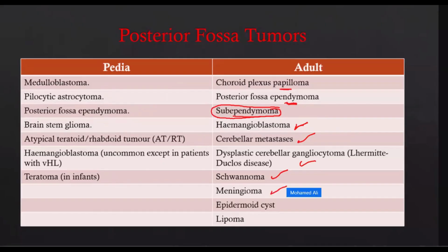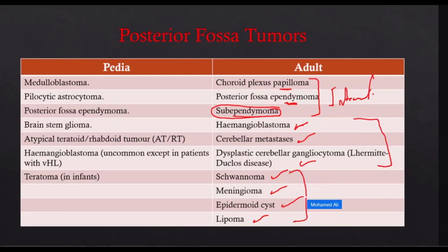Meningioma, we saw a case of meningioma. Epidermoid cyst, we saw a case of epidermoid cyst. Lipoma also. Those are intraaxial, inside the cerebellar hemispheres, and those are extraaxial.